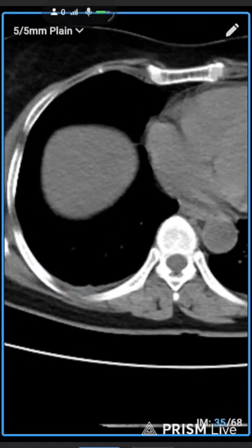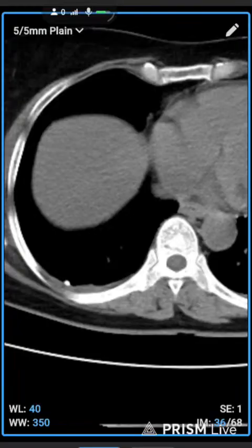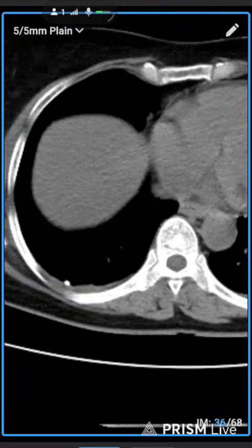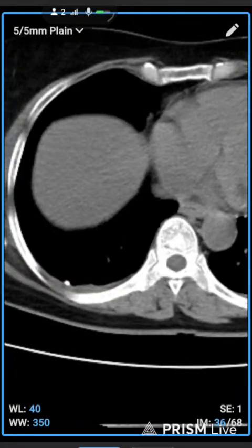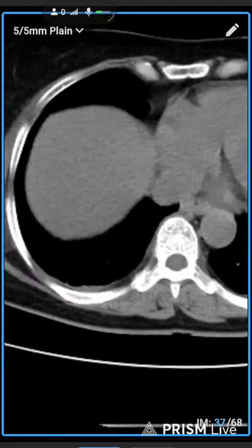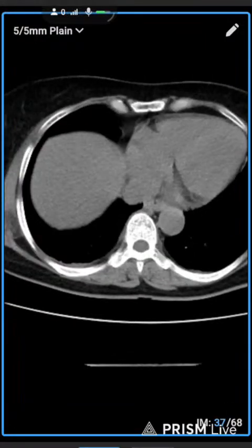So if you see that type of calcification in the lung, it means a disease like TB or a similar disease, after it dissolved, converted to calcification. It's totally dissolved. After that it converts to calcification. So it can appear with some type of shortness of breath or chest pain. So this is the diagnosis of this patient.